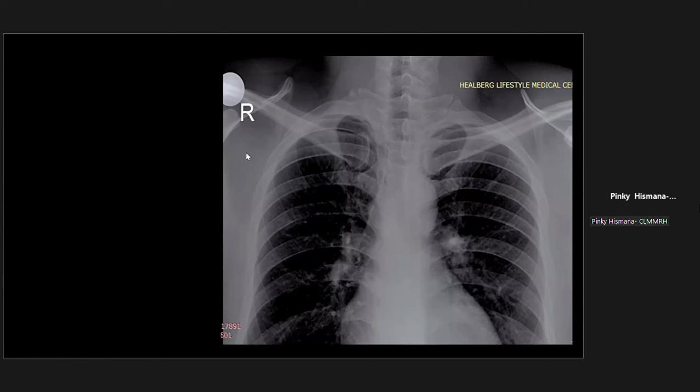Carina is something that we also usually use often, because actually the carina, especially this point, the pointed tip of the carina, it is where you start measuring whether the endotracheal tube of the patient is in place or not. Nevertheless, as to the difference of the right main bronchus and to the left main bronchus, please take note. Anyway, that's the trachea, right main bronchus, left main bronchus, and the carina.